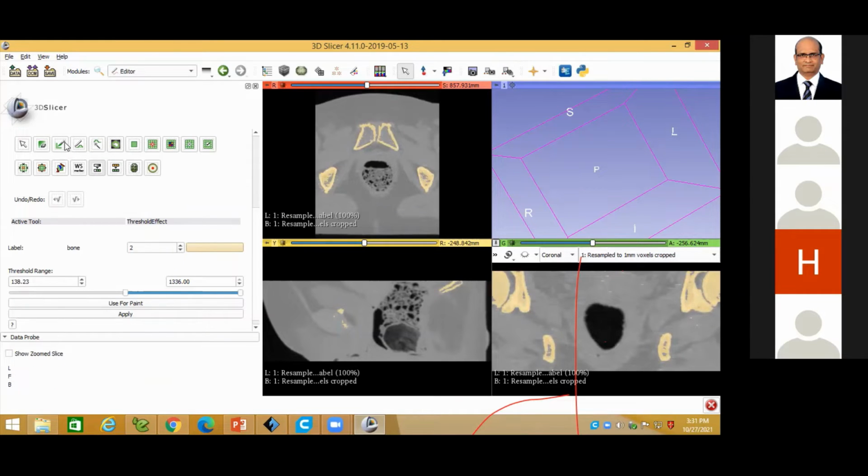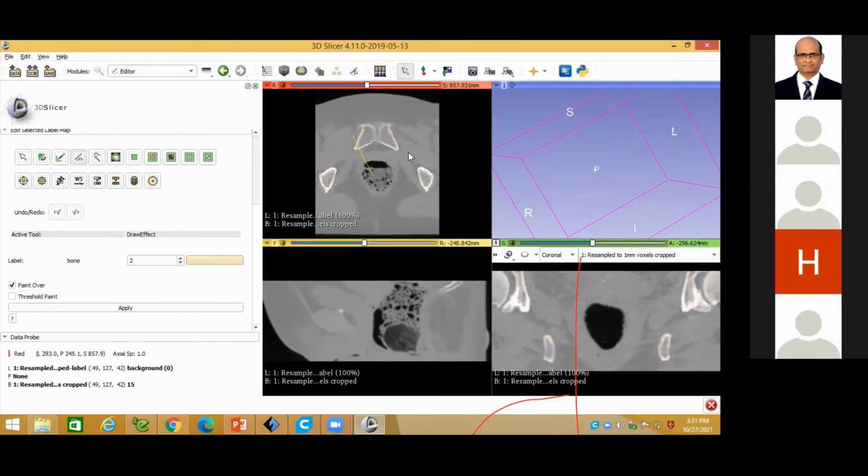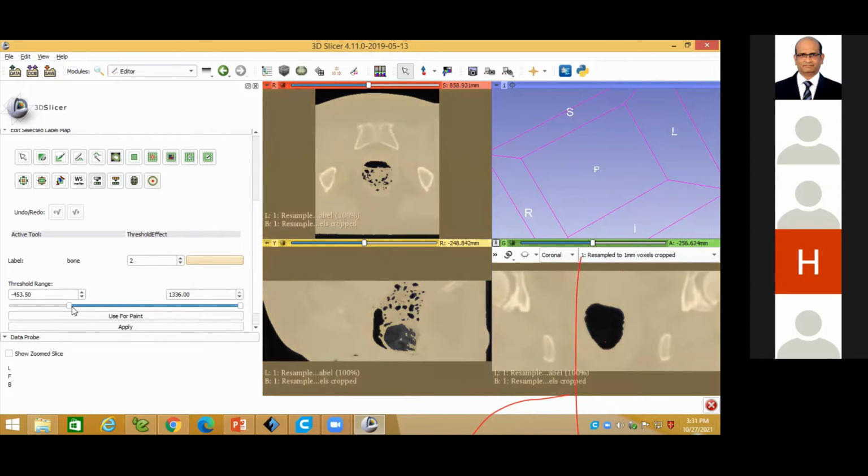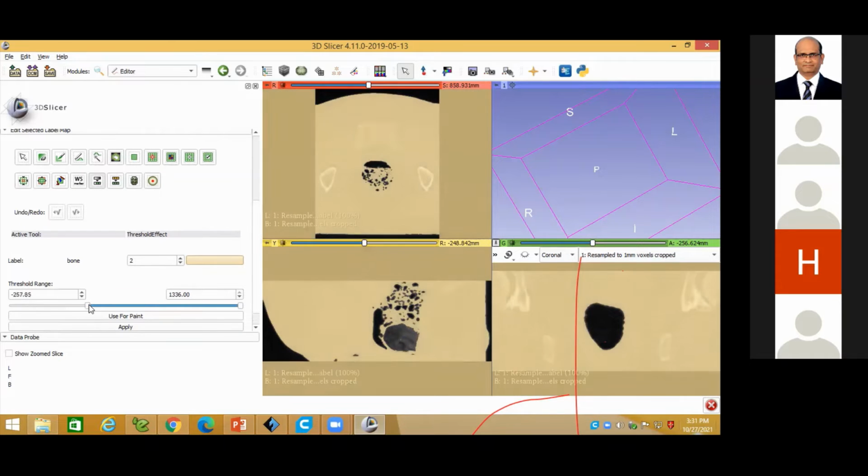Now, if you want, you can add some layers. If you want, you can remove this one. Okay, what we are doing, our paint in paint, whatever the options are available, like that you can do it. If you want, you can paint. You can extract the information. You can write something. If you want, you can draw something here, like that you can do here. Like that, what you want, you can do it here. So I'm going to do the shouldering. So once again, like that, different options are available. Because of this time constraint, I'm not giving so much information. Just whatever we require that I'm going to give here.